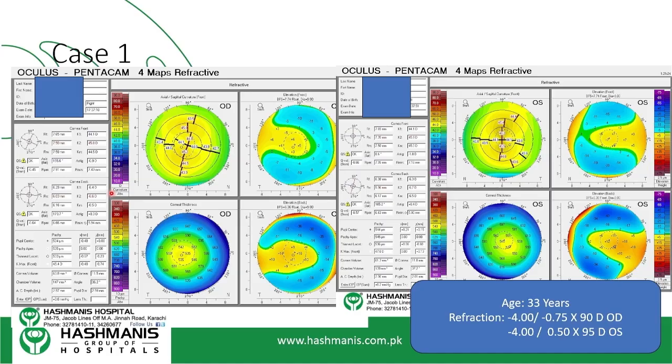So we've gone through a lot of information, so let's consolidate that. Anytime you're looking at any sort of topography data, before you start off with anything, you have to see the patient first. There are too many instances where we're just looking at this printout and then saying this is either abnormal or normal. You cannot interpret this data without actually looking at the patient.